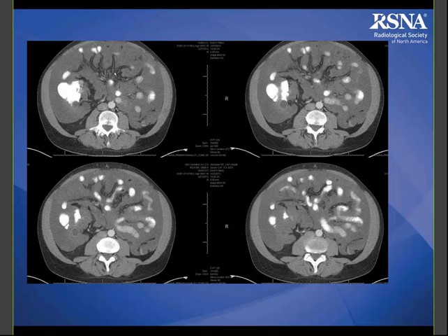And with all of the ascites and this omental thickening, this was a pseudomyxoma peritonei, a low-grade appendiceal mucinous tumor, but still, nevertheless, the appendix was the primary. These can be really hard, I think, to call because, especially if there's a lot of carcinomatosis and ascites, it can be very difficult to find the appendix.